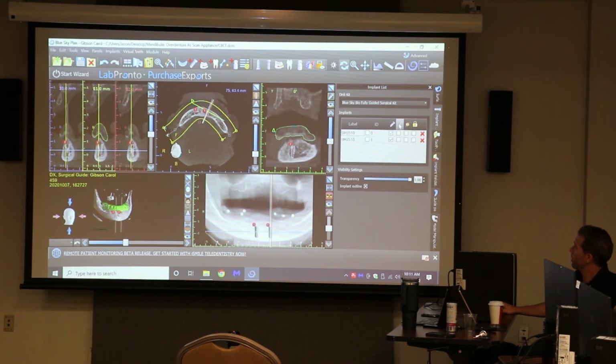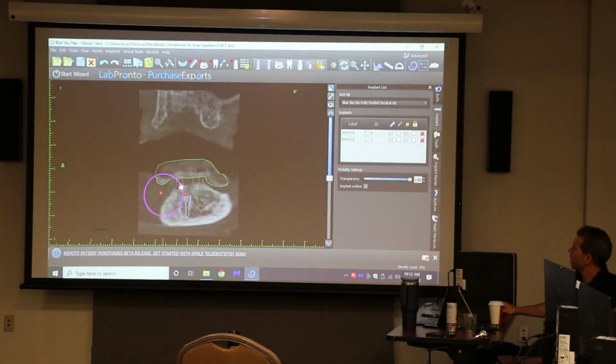Here we have our abutments. We're not putting abutments in for this case. And then here are these guide tubes. So we put these guide tubes on. Let's look at what these do here. These guide tubes are what we talked about being the actual part that gets incorporated in the guide. Look at where this guide tube is, you can see the outline. This yellow is the guide tube. Here's the denture. So we want to get these up.